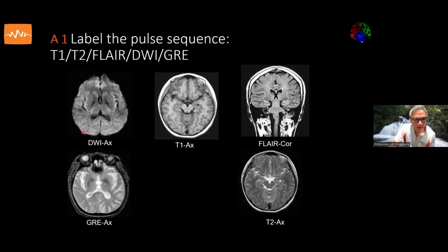Lastly, a DWI picture can be recognized usually when the image is seen as a very low spatial resolution picture.